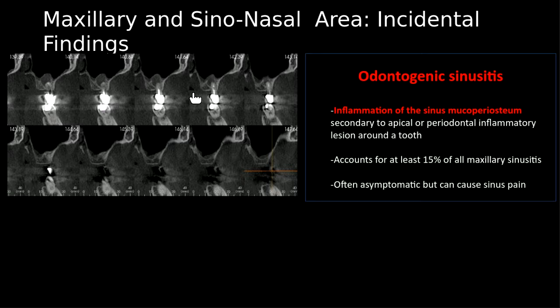Now, this is a very, very popular thing coming up these days. Our ENT friends are sending a lot of cases where the sinusitis is coming only from the tooth origin lesion. So you have to know exactly which tooth is giving rise to that lesion. You can see the tooth root is producing a lesion there, and there's a sinus floor elevation here. You don't want those things, and it's good you see those and treat it nicely, and then the sinusitis, everything will go away.